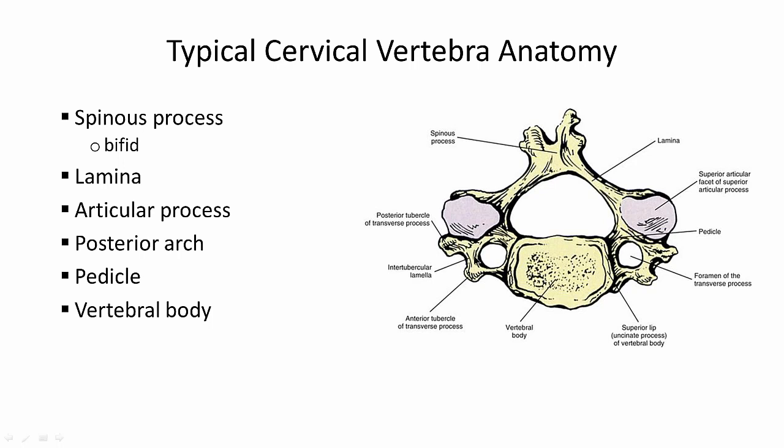What else do we need to talk about? Here's the anterior tubercle again, posterior tubercle, and that space in between, intertubercular lamella, and then they don't show the whole groove, the neural groove for the spinal nerve and ventral ramus. Vertebral body, we did that. Vertebral canal here, right? That's where the spinal cord goes. No thecal sac here, though, right? Or no cauda equina. You still have a dural sac around the spinal cord itself, but now we have a real spinal cord.